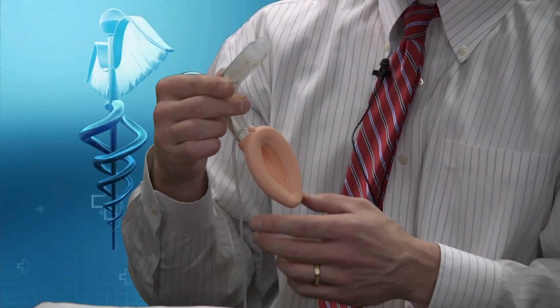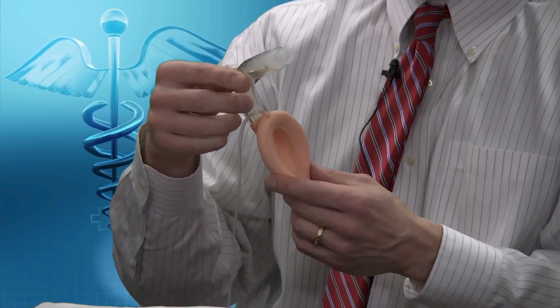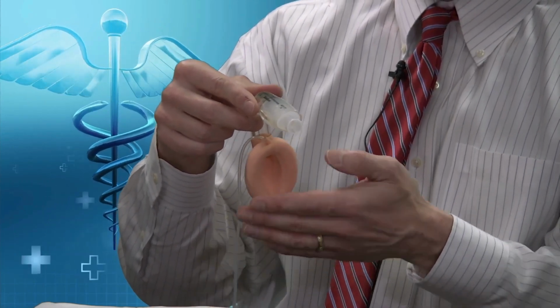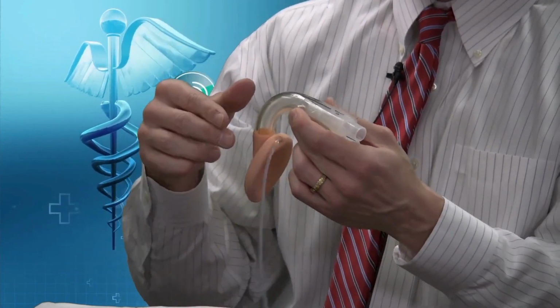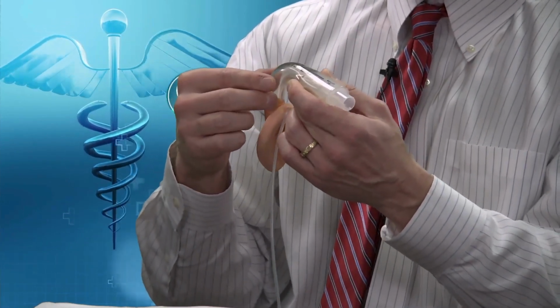Yep. This other device here is called an LMA, which stands for laryngeal mask airway, and this is inserted once again after the patient is unconscious, but instead of going into the windpipe, this piece here sits right above the opening, above the vocal cords, the opening of the airway. I like to call this a mask on a stick. It's essentially the same thing as a mask over the nose and mouth, just placed a little bit deeper down into the airway to be more secure.